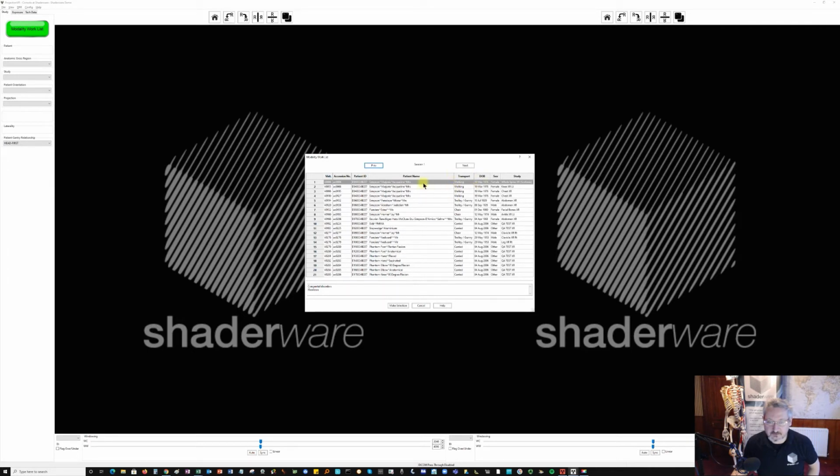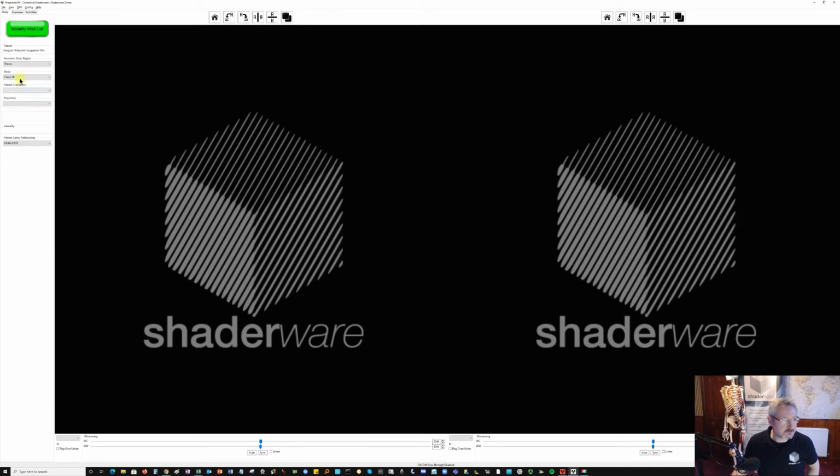I'm just going to pick Marjorie Simpson here, who's a walking patient. Make the selection, change this to pelvis. And it's going to be an AP pelvis. And we've got it at 75.